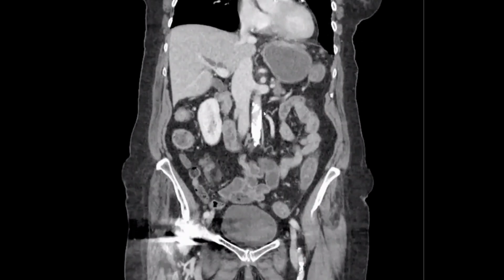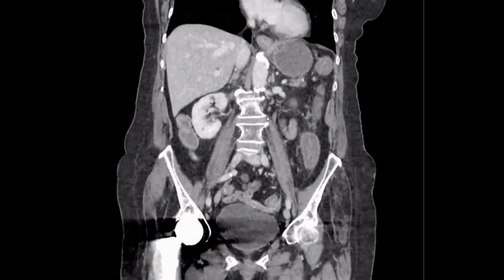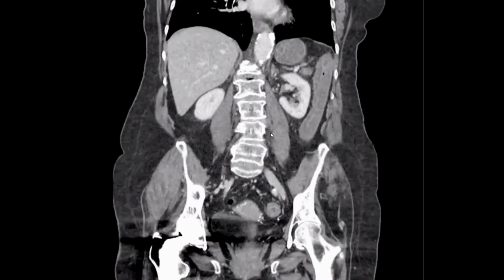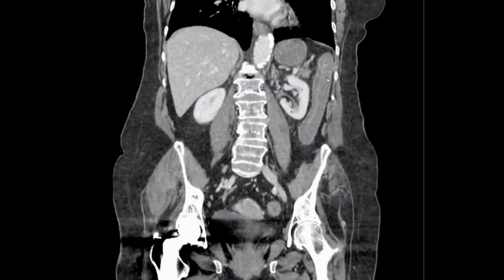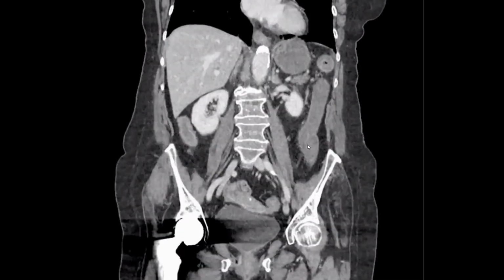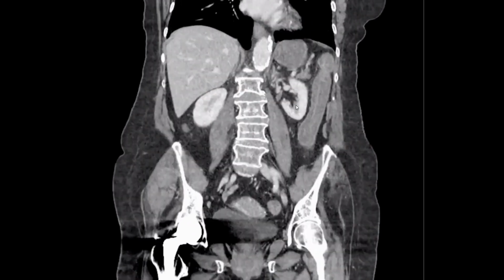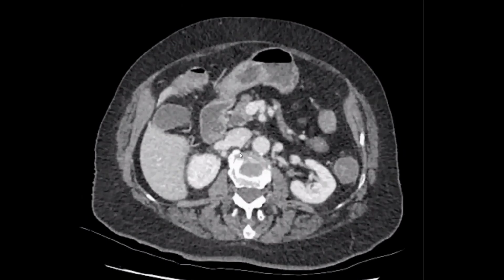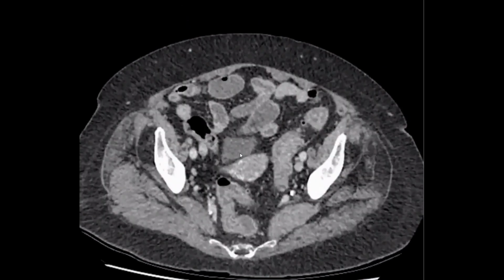I know that you couldn't identify any obstruction of the mesenteric vessels, but we said in the last session that we can have non-occlusive ischemic bowel disease. A hypoperfused bowel segment can lead to ischemic colitis without any obstruction. But I can't see enhancement in the mucosa and the wall. Am I right? Yes, it's hypoenhancing. It's matching with ischemic colitis. And even the pericolic fat planes are not so much smudged. Do you agree? Yes. It's not typical of acute inflammation or infection. Acute inflammatory changes. Yes, you're right.